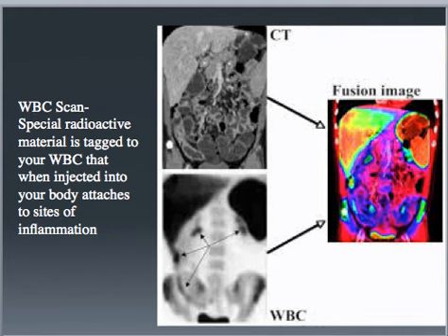This is another fusion imaging with CT and nuclear medicine. So this is that white blood cell scan that I had talked about before, where they take that special radioactive material and tag it to your white blood cells and then re-inject it into your body, and then it's going to attach to the sites of inflammation.